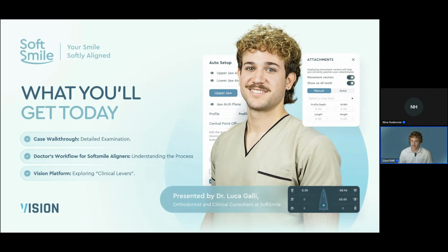As Nina mentioned, I will be presenting a comprehensive walkthrough of a complex case. I'll be taking you through my entire workflow from the initial clinical diagnosis all the way to sending the final setup for production within the SoftSmile and Vision ecosystem.